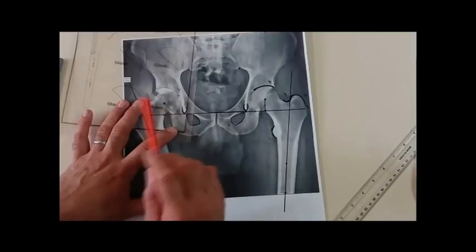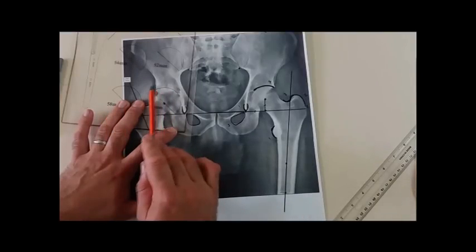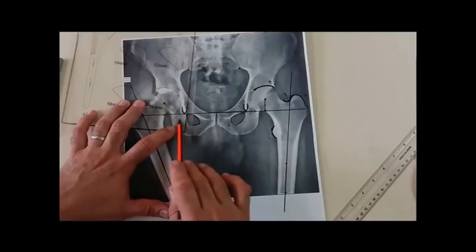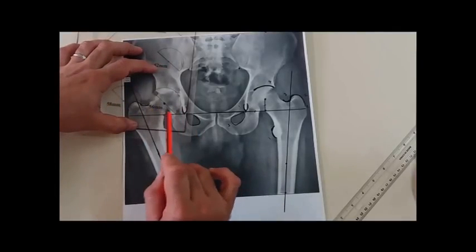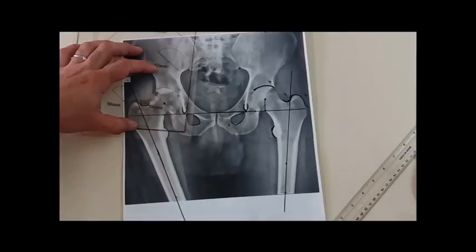Of course, another option, if the uncoverage is still unacceptable, we can deal with bone graft and a lot of other solutions. So by finishing this step, we have already determined the size of the acetabulum. In this case, for example, it is a 56 millimeter cup size. The angle of inclination is 45 degrees.